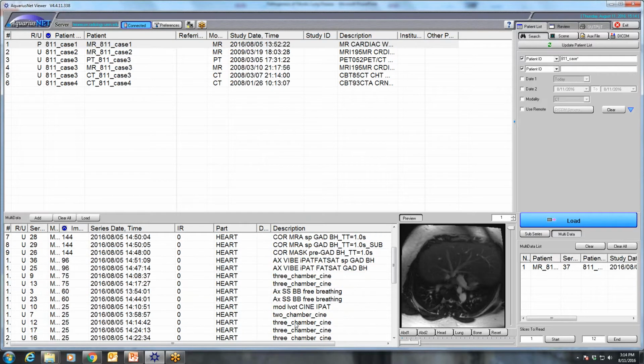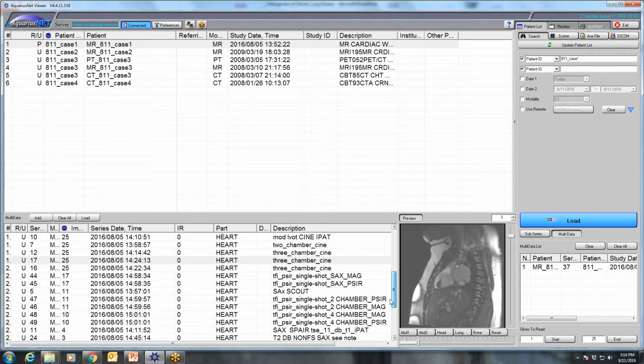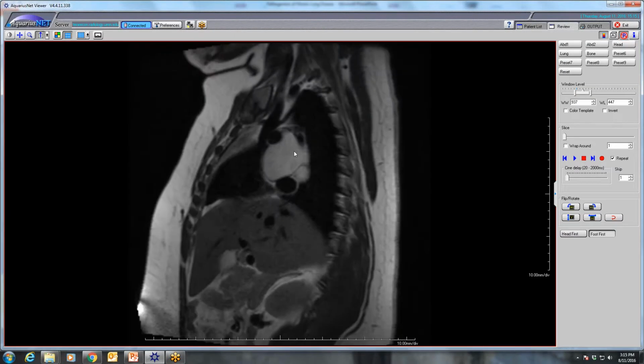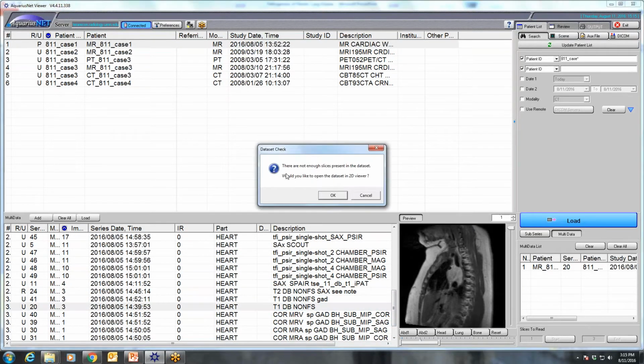I had never seen this. We see IVC continuation or azygous continuation not that infrequently, but to see a hemiazygous continuation is something we had just not seen before. And on top of that, she has this mediastinal cyst, which was quite bright on T1.